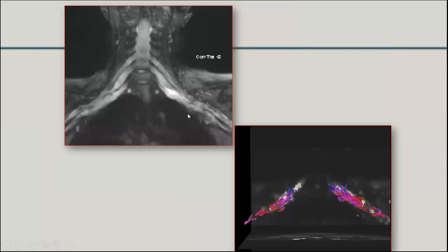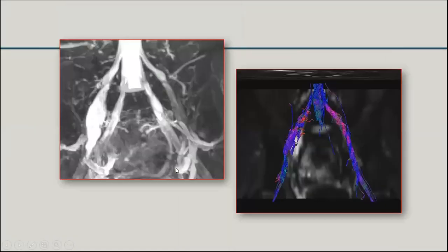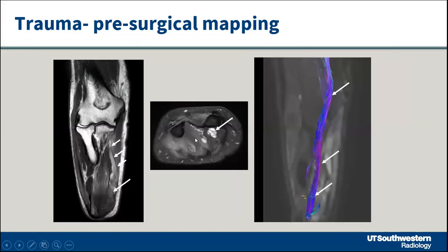Versus this one, bilateral thickening, symmetric, so we know it's Charcot-Marie-Tooth disease. So they may have, if it's a thickened nerve with thickened tract, a little disorganized, we know it's CMT1A. Versus if it's a mildly thickened nerve with not much tracts there, we know it's CMT type 2, where you have more axonal degeneration, more loss of tracts. Here's another perineurioma. Again, most of the tracts are maintained, low ADC value.